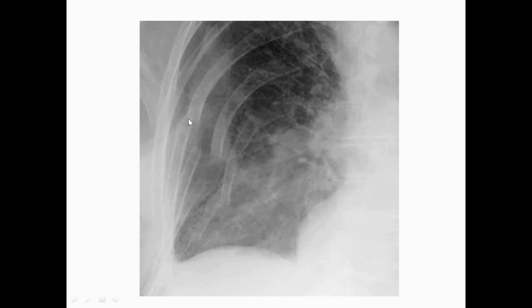multiple displaced posterior rib fractures. Look, this is very clear. But sometimes how are you going to know there is an undisplaced rib fracture? Because it's very difficult to pick up an undisplaced fracture. So you're going to usually trace the rib. Suppose this is the rib, yeah? Just trace the outline of the rib.